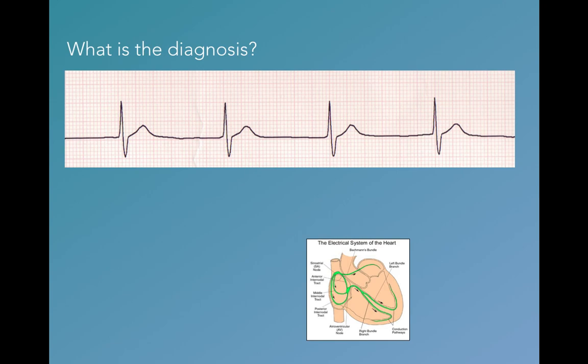So as you know, less than 120 is okay. So this is close to being prolonged, but you would say this is normal. And the T waves appear normal. As I said before, the T wave is nowhere close to being in the middle of these two. And of course you want to look at the rate, so 300, 150, 100, 75, 60, 50. So this is slow. There's no P waves, normal QRS, normal T waves. So if you pause it, try to think of what the diagnosis is.